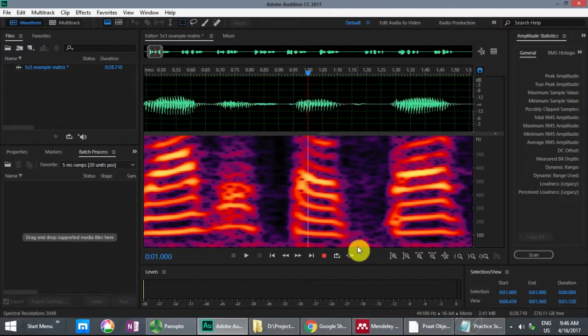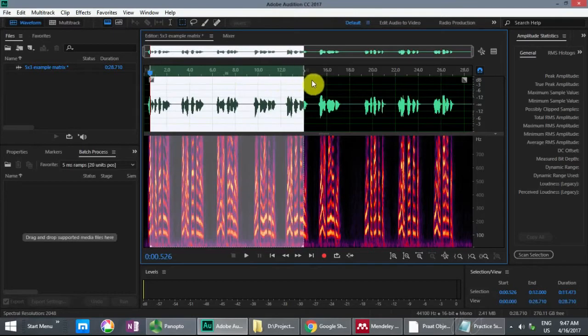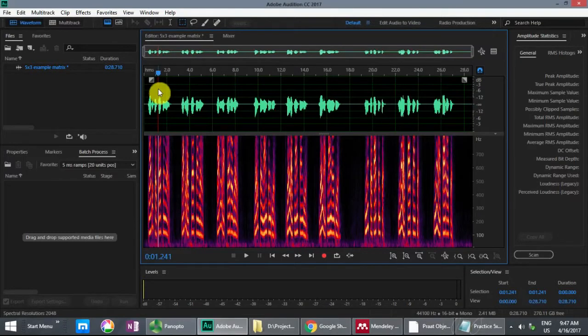Now there's a couple of possible editing strategies that you could use. One would be to simply edit all the way through your recorded WAV file. And that seems to be the most obvious and easy approach. However, I don't think it'll be the most successful approach for you. The reason for that is it's very important to make your cuts in consistent places within the length of the phoneme. So the approach that I recommend is to edit in a way that allows you to monitor your edits as you go along, and I'll show you how that works.